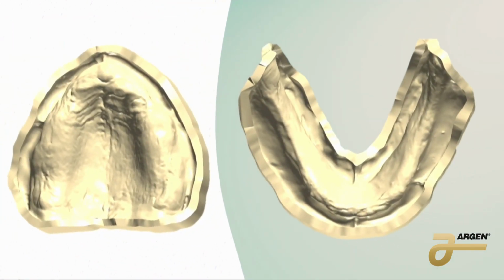After we have trimmed them digitally, this is what we have. So we have full retromolar pads. We have a nice deep sulcus here. We've captured all of that. We have the full roll. He's taken a long time to take a really good impression. I'm not going to cut any of that information short. If this was overextended or overfilled or something like that, this is where I can analyze it. Even on an impression that is definitely overfilled, definitely overextended, I still trim it really high so I can look at my virtual model and make my decisions after that. I'm not trimming my model really short. I'm trimming my denture base short.